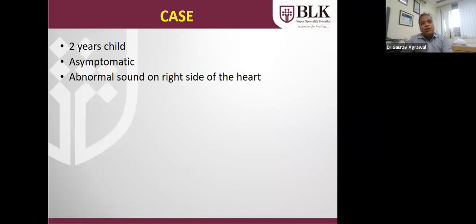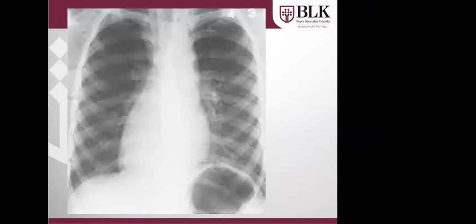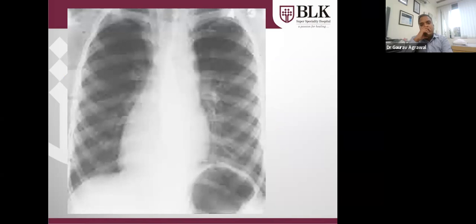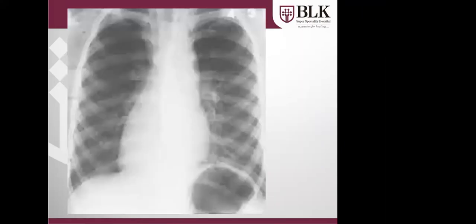A 2 years old, asymptomatic, abnormal sound on right side of the heart. Comment on the X-ray, please. Right heart enlargement, sir. So dextrocardia. Yes, dextrocardia. Situs solitus, dextrocardia is the X-ray finding.